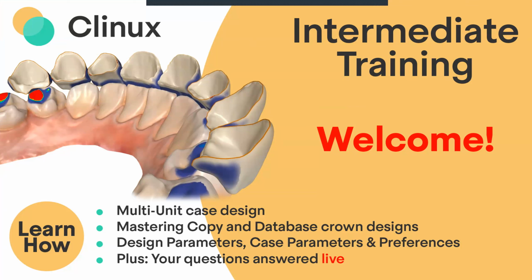We're going to today learn how to do multi-unit case design. We're going to look at mastering copy and database crown designs. We're going to do a deep dive on design parameters, case parameters, and preferences.